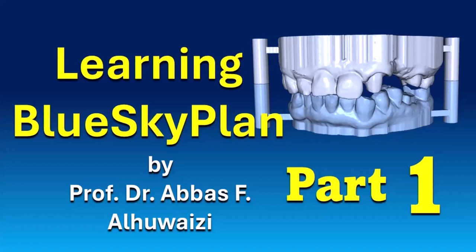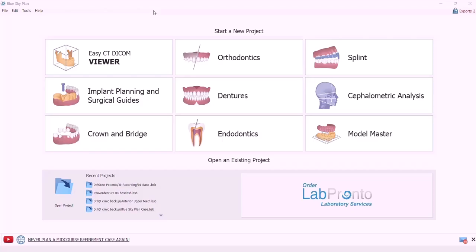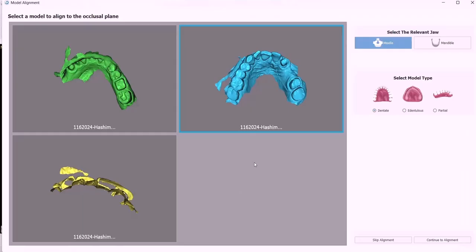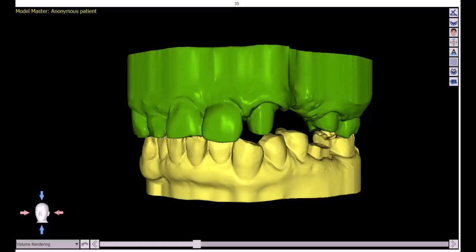Hello, this is the first lecture of a series of lectures in which I will talk about the Blue Sky Plan software. In these lectures, you will learn the fundamentals of this program and how to import the data from the intraoral scanner and make a model with a base and articulate them. Then we will learn how to design crown and fix bridges, and finally, we will learn how to export the design so it will be ready for printing.